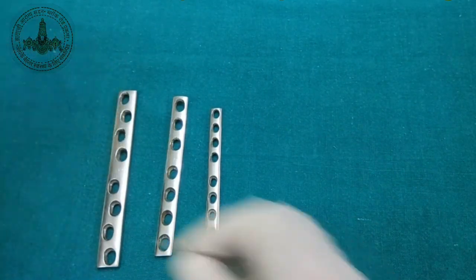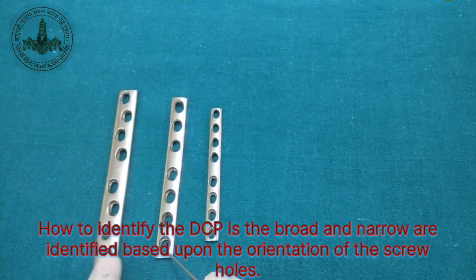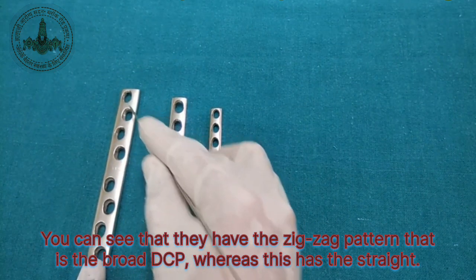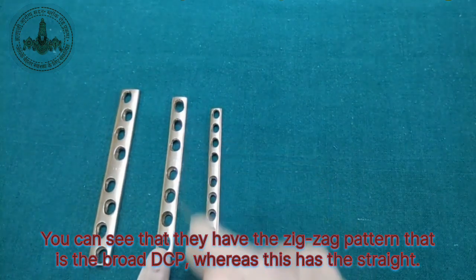How to identify the DCP: broad and narrow are identified based upon the orientation of the screw holes. You can see that they have a zigzag pattern, that is the broad DCP, whereas this has a straight pattern.